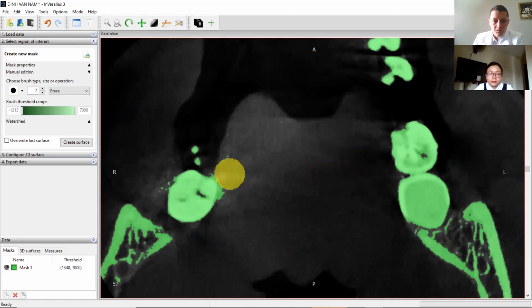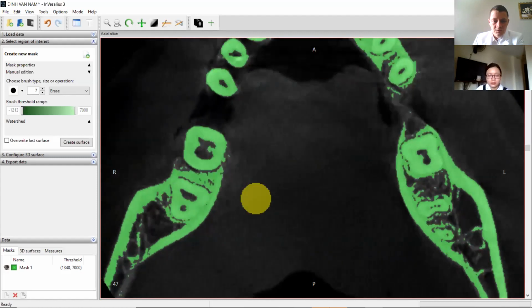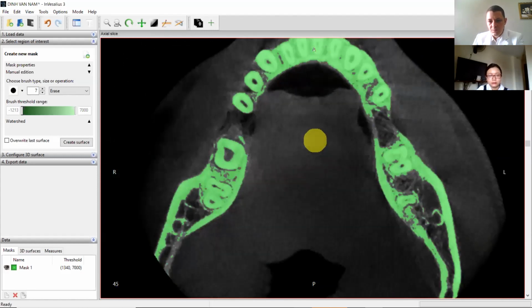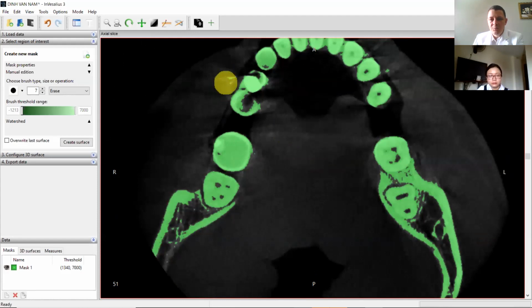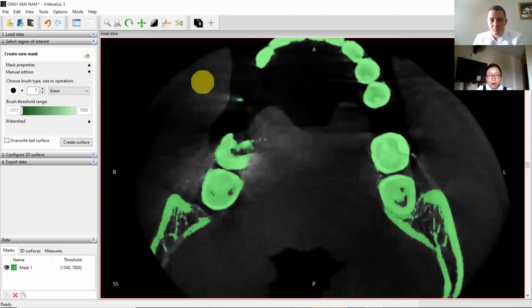Okay, this I don't like. Okay. Should be very nice. So you see here, I don't clean, I don't remove here. Thì mình sẽ thấy có một cái phần mà bác ấy không có bỏ đi. I don't remove because the software will know that the object are not touching.